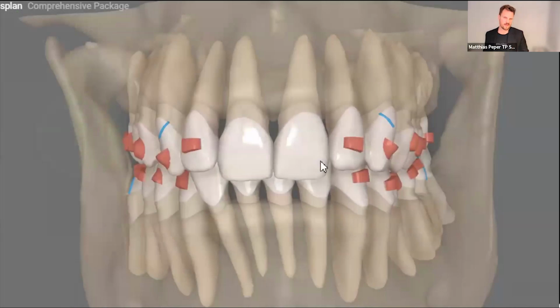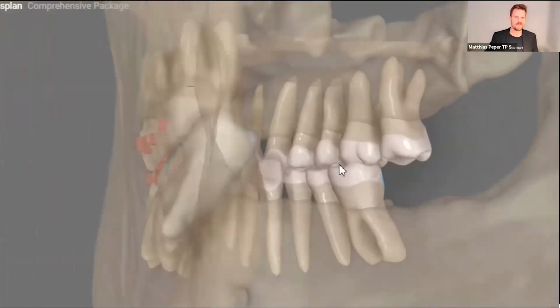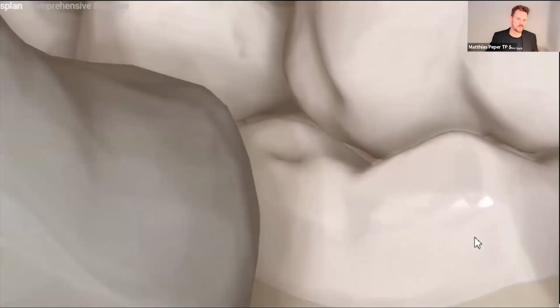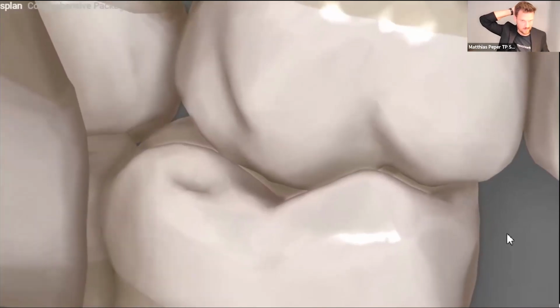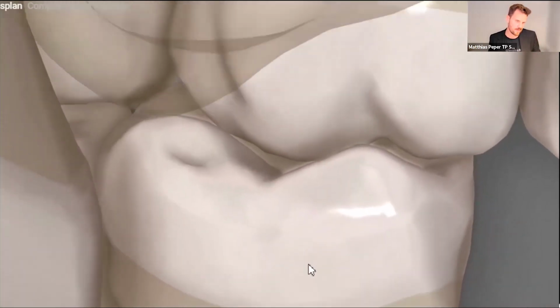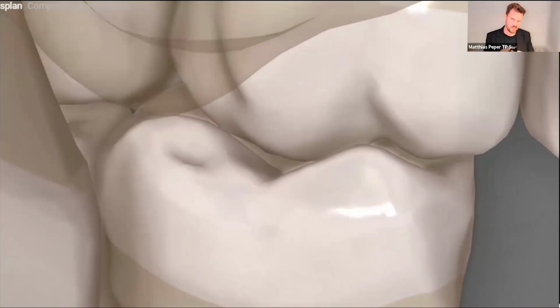And if I have another look at this treatment plan, I can see that at the beginning, I had a very nice intercuspidation in the first and the fourth quadrant. I can see that the intercuspidation at the beginning was pretty perfect in the molar area. And we destroyed a little bit with the distalization. Yes, it's only a little bit, but we would make a new decision, not doing the distalization, maybe doing a little bit more out rotation to not change the nice intercuspidation in upper and lower arch.